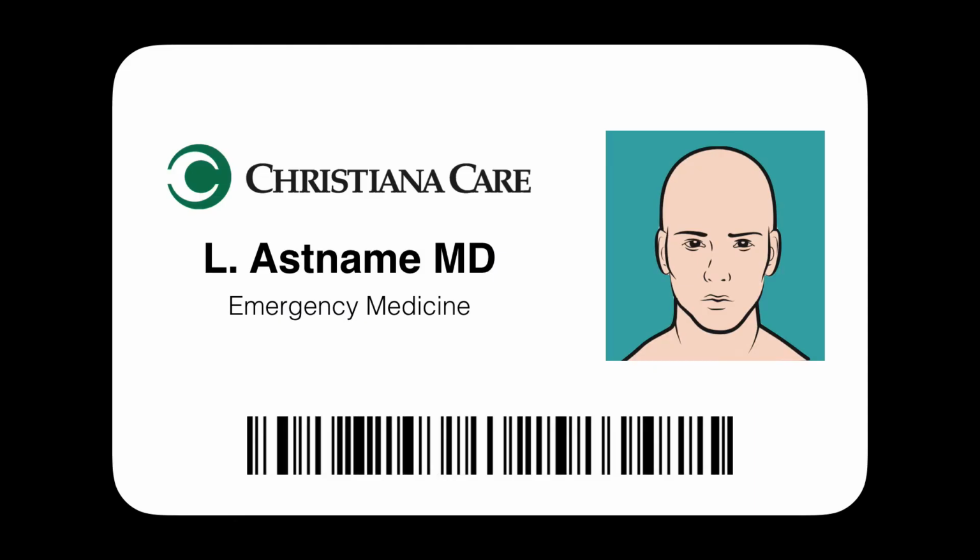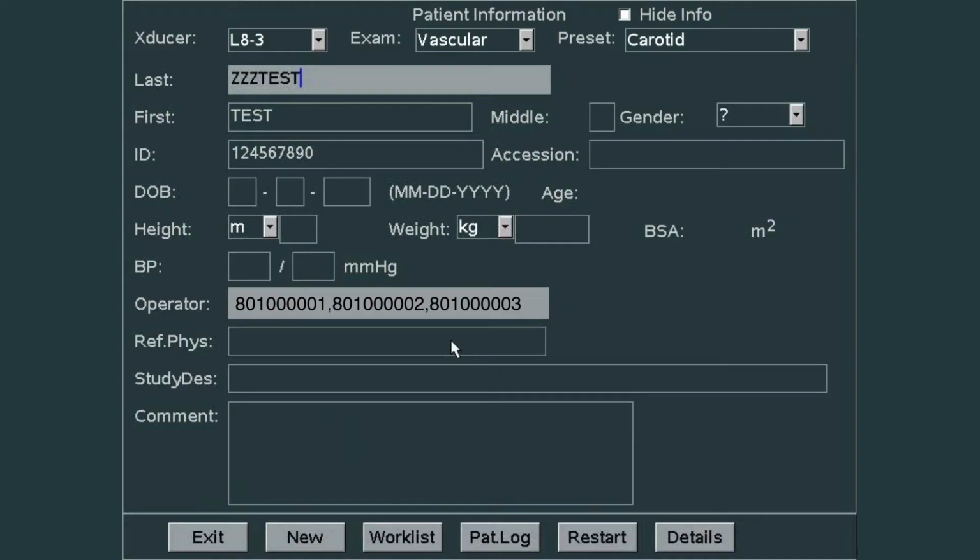You can also use your badge to scan in your provider ID number in order to link that to the system in the study. And you can see here, this is a sample information page where you have the operator information and the patient information that has been pulled in after barcode scanning.